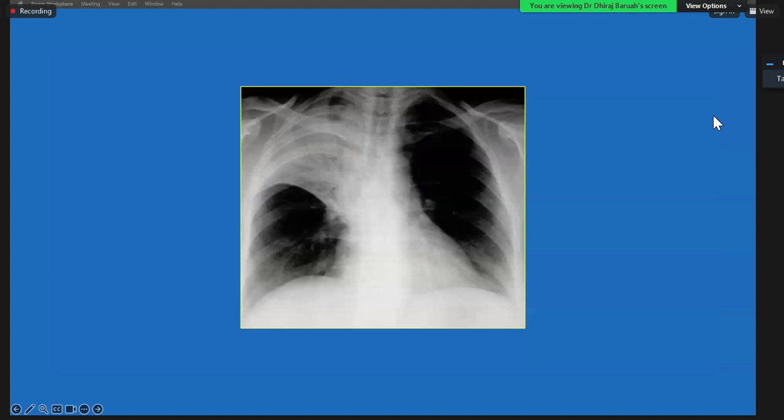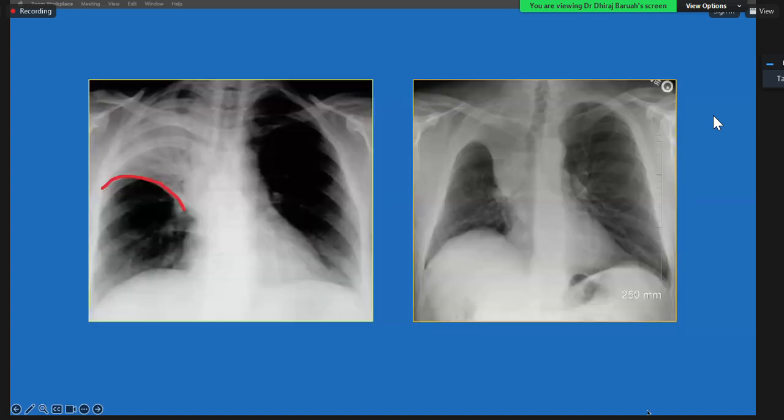So this is probably, as you all know, very simple. There are air bronchograms, an opacified lung, and there is pulling of the fissure, so there is some component of collapse. It may be a consolidation with collapse or just a collapse of the lung. But sometimes you may see this. You may see the fissure that would be pulled up because of collapse displaced down here, not necessarily pulled up like here. In these cases, you worry about a mass lesion displacing the fissure, occluding the bronchus and causing collapse distally.